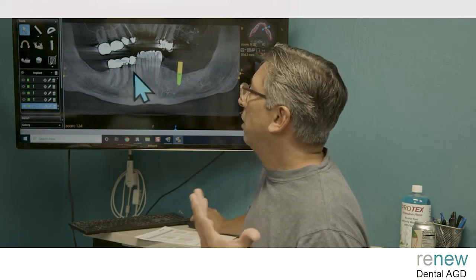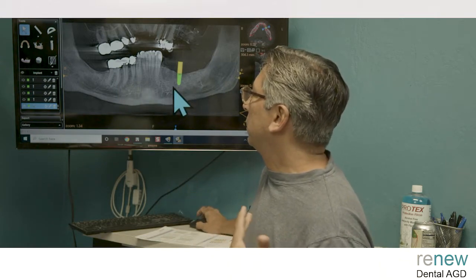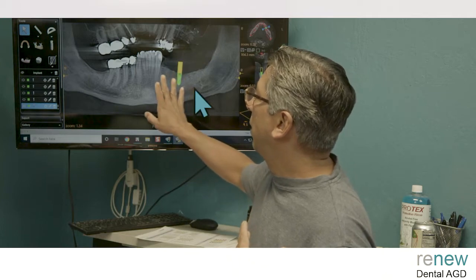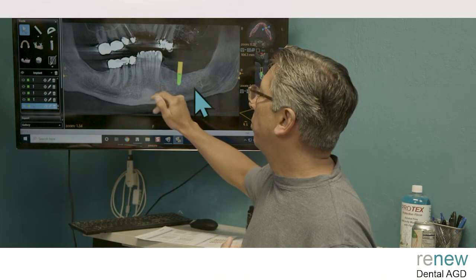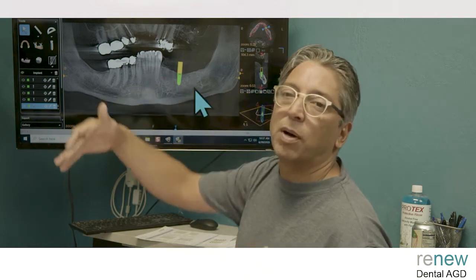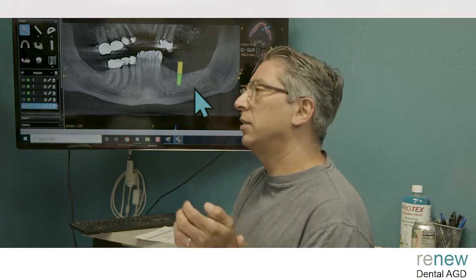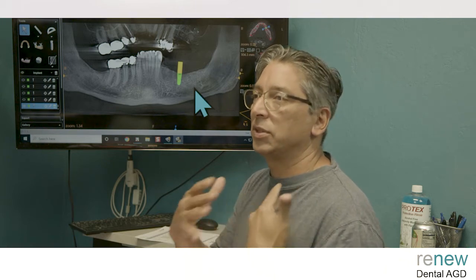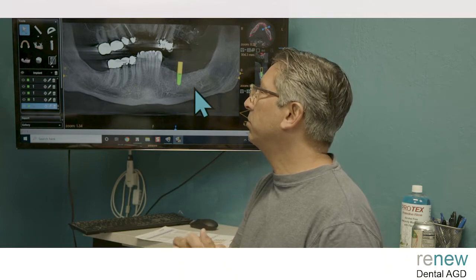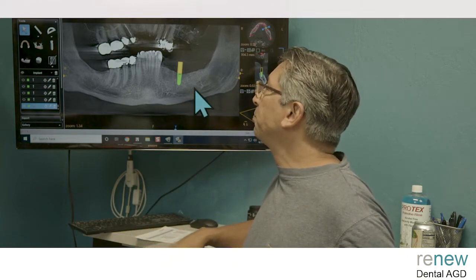Other teeth over here, he'll need to have dealt with by general dentistry type stuff. So that's not a big deal. But now the question is, if you're doing a 4.2 here, do you do a 4.2 here and a 4.2 here and then splint them all together? That's a tough one too, because you could do a lot of hygiene with them separated. A lot of dentists do like to splint them, so I would leave it up to what the dentist likes to do. So that's a bit for this one.